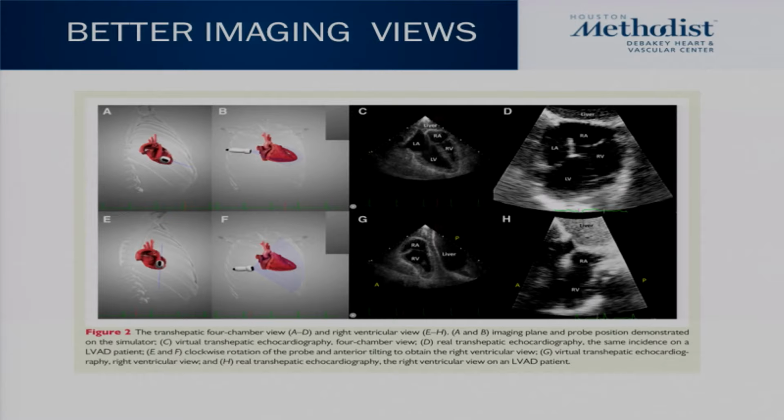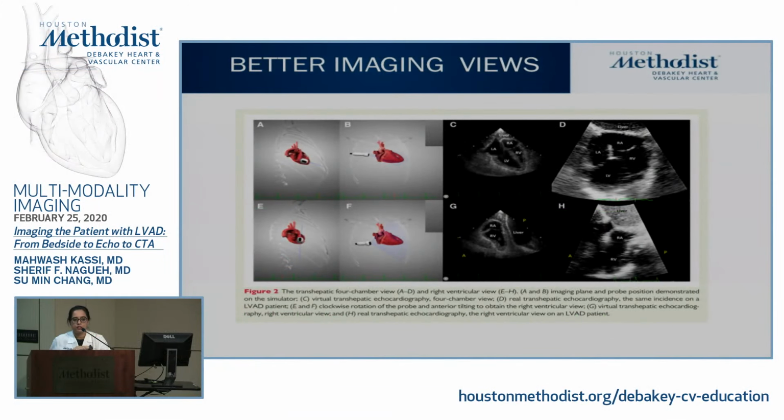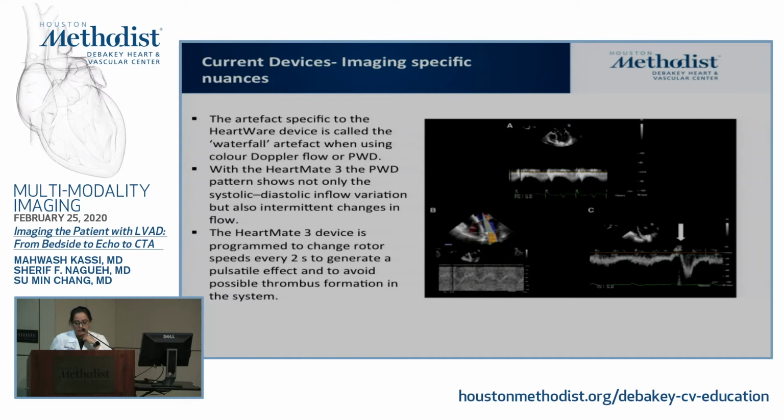But there are alternatives. One of the other imaging views that I stressed last time is getting a better view of the outflow cannula. I would reiterate that you should do some other off-axis views to get the outflow cannula and Dopplers of the outflow cannula, because they're going to be very relevant in the upcoming conversation about aortic regurgitation and how we quantify that.